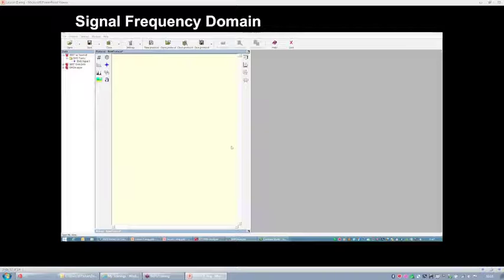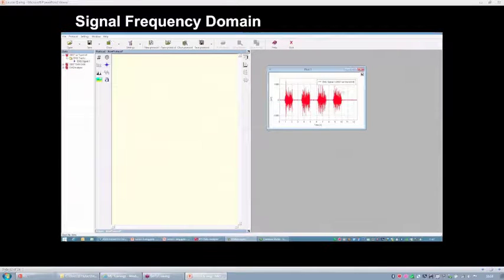So now I want to show you how you can compute the spectrum by means of our EMG analyzer application. So this is an example signal. Imagine that now we can compute the spectrum. We have a specific block in the application to compute that. You can choose between the DFT or the periodogram of Welch. The first is the discrete Fourier transform.